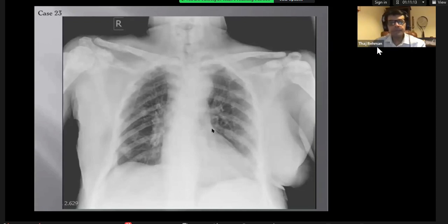Yeah, so that's fine. When you're in an exam setting, even if you make a little error, don't worry. Just say that because it's a chest X-ray, it's unlikely to be a breast mass. It's just the breast rotated to one side. So you diagnosed right mastectomy with widespread bony and lung metastasis and pathological fracture in the clavicle.